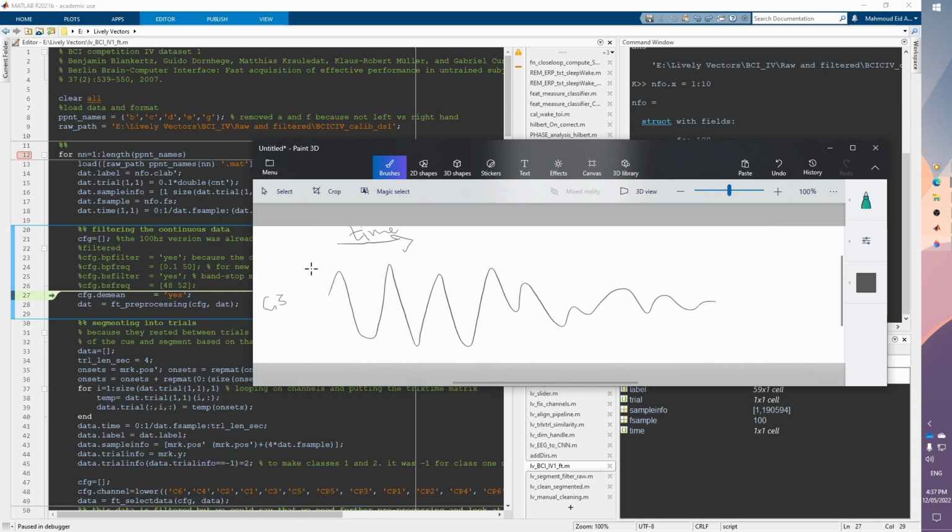So let's say this is our scale, and this point is -3, and this point is 3, and 0 is here. What this will do is take the average of all of these points right here. So we can say that the mean of all of these time points will be -3, so they are looking more or less around -3.